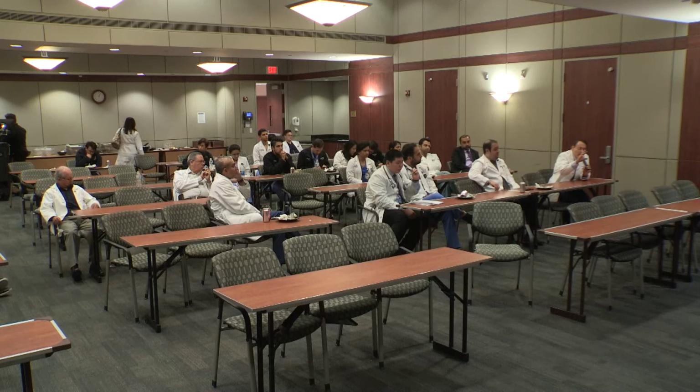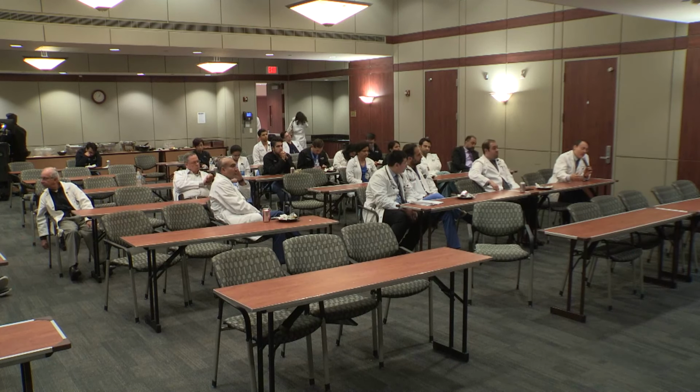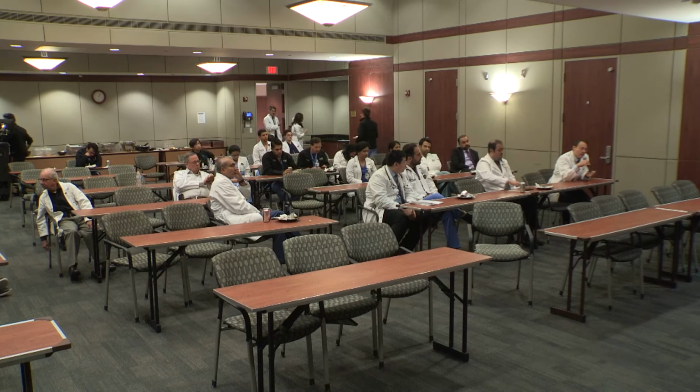Do they need speed optimization? Do we need to increase the speed? If they have symptoms of fatigue and shortness of breath, then we'll also do a right heart cath and echo. You showed a hemodynamic study that compared just control echoes versus something guided by cath and imaging at intervals. Right. And you show different uses of medications.